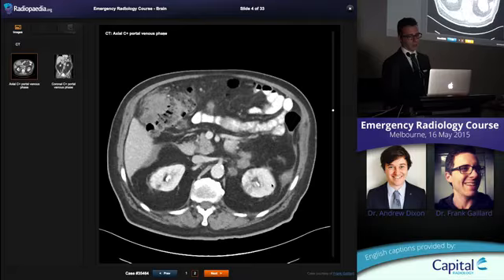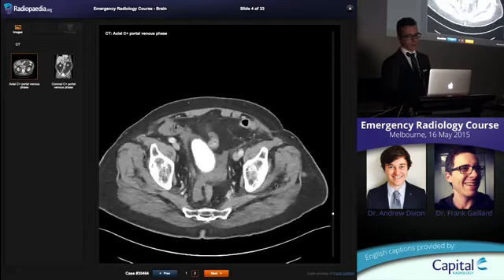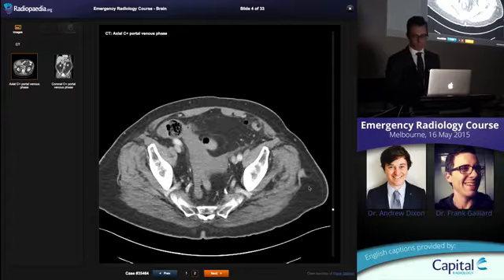And this isn't even of the colon, it's just running next to it. And we have lots of other lumps and bumps, including one in the subcutaneous tissue, which is a very unusual place for most of these to go to, with the exception of melanoma. So you put these two things together and you can be very certain before the histology comes out what the diagnosis will be. And this was metastatic melanoma.